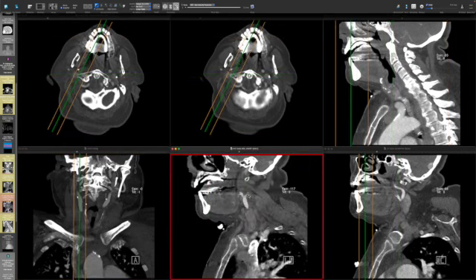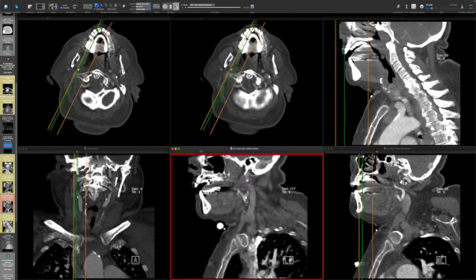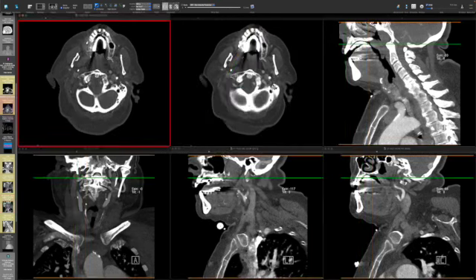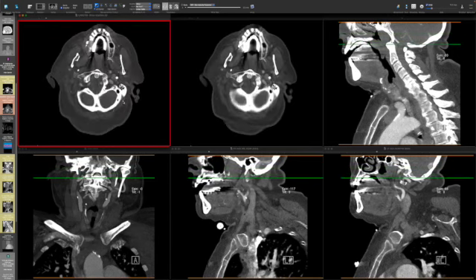Again, here's our oblique sagittal reconstructions. Here's the external carotid artery on the right with its nice little branches coming off. If we follow up the internal carotid artery, it just comes up here and stops after this stump. So we have a right internal carotid artery occlusion, which is what we expected to see based on our CTA head findings. Okay, so obviously right ICA, very abnormal.